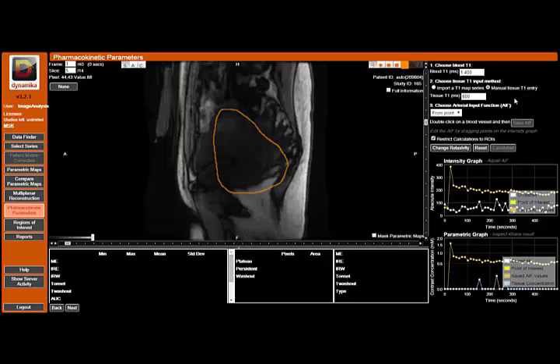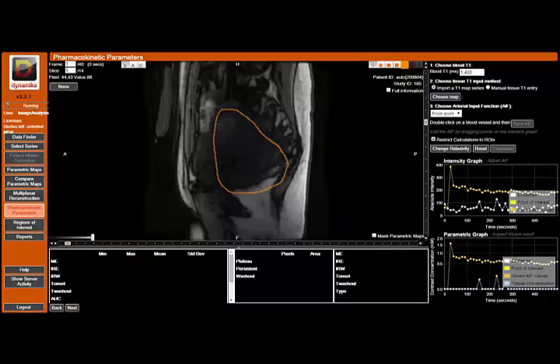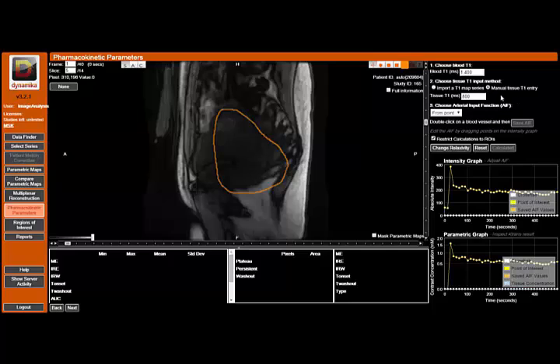We also need to understand the T1 values of tissue. Now, these can either be calculated from a sequence of MRI scans taken with different flip angles and reconstructed. If it sees that there is a series of variable flip angle sequences, then it will calculate a T1 map automatically that you can use. If you were to go to that and choose it, you would have to choose the map. This particular series has no map available, I'm afraid, so I won't be doing that on this series. Otherwise, you can enter the T1 value for tissue manually. Here we have a value of 800 milliseconds, which is kind of typical of most tissues, but will vary between different parts of the body and different patients.